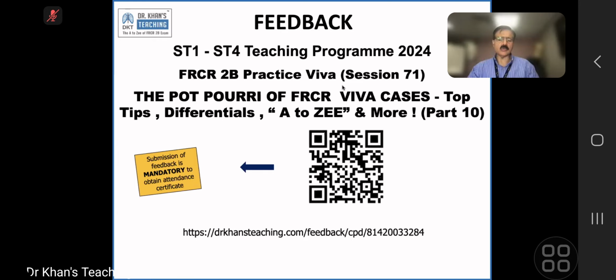But it can also be high because of hemorrhage. Because this particular cyst had internal high signal on T1 and low signal on T2, means hemosiderin, means chronic hemorrhage. So we will say that it had a hemorrhagic component. High signal on T1 is because of proteinaceous content or because of hemorrhage. But in this case, because the T2 was low, it is because of hemorrhage.